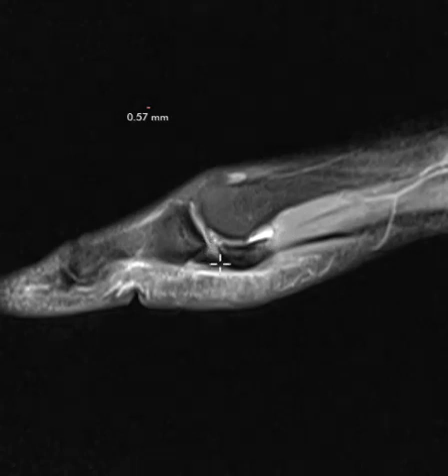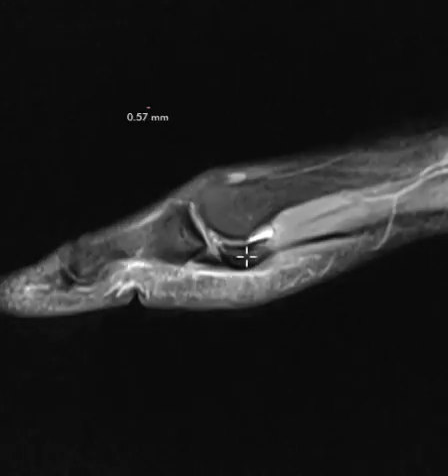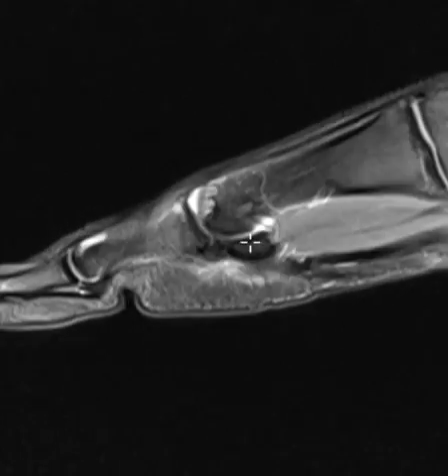Some of the ligament is intact, but over here there's an area of brightness, and you can have a small little defect here. This looks like it may be too big, so this may be partially torn, but it's not ruptured. When they're ruptured, the sesamoid bone will drift backwards, and again, it's not even thick, so this is a questionable finding. But again, there's no plantar plate rupture. The sesamoid bone is in normal position, so this is, again, mainly stress reaction or stress injury of that sesamoid bone.